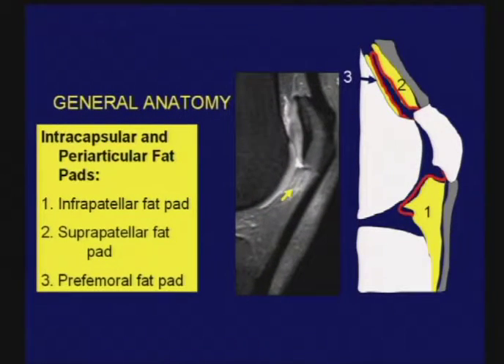The third fat pad we will look at is Hoffa's fat pad. A very common finding that we see, particularly in young people and more often in women, is edema involving the superolateral aspect of Hoffa's fat pad as shown here. This is not very dramatic. In some cases it is certainly more profound, but this is an important observation. This is a clear cause of anterior knee pain. It's associated with patella alta, as it is in this particular case, and then associated with altered patellar tracking. So this should be noted in your report.